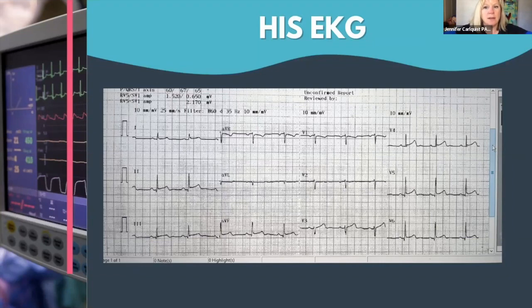But he also could have benign early repolarization, which is something that is, again, going to look a lot like pericarditis. So then one of the things you can do, if you're not sure, is do an echo. Of course, that's always the answer, if that's a possibility. But you're also looking for, especially in lead 2, PR segment depression.